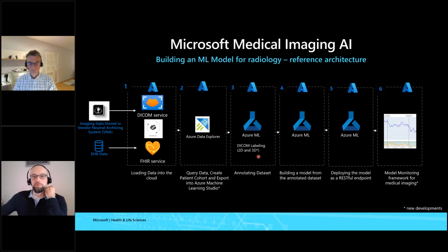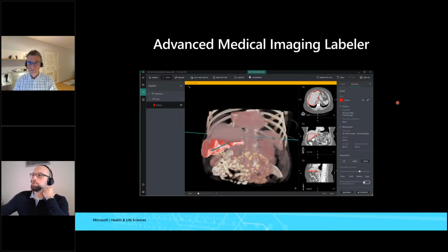We're working on a tool which I'll show momentarily, which addresses the more advanced use cases for annotating medical images, more advanced, as we call them, the modalities, types of medical images. And we work on this model monitoring framework for medical imaging. And actually, I'm proud to say that we've just released the paper on arXiv. I'll say a few words on that closer to the end of my section. But for now, let me show you this annotation tool that we're working on.